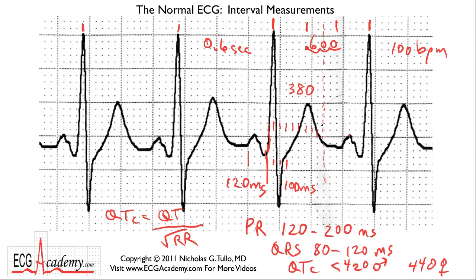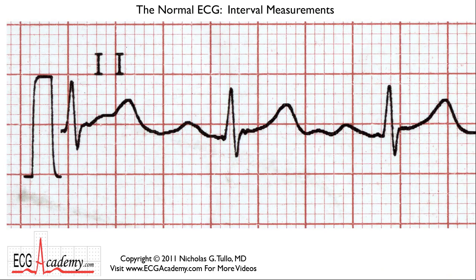Okay, one last example. This one's a little bit harder because the QRS and the P wave is sort of small, and it's kind of hard to measure. But let's do it really quickly. Now, here's a QRS that's very close to the heavy line. So let's count off 300, 150, 100. This would be 75. It's closer to 75. It's probably something along about 85 beats per minute.